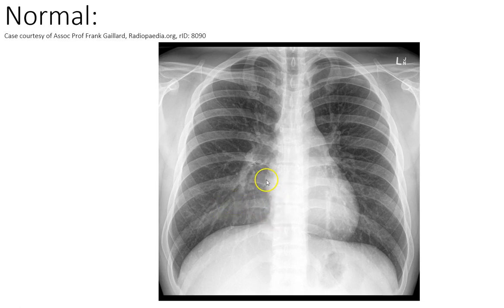I think the more likely cause of the left hemidiaphragm being slightly lower is that you have this large organ, the heart, which is quite heavy when it's full of blood, and it sits on that left hemidiaphragm.